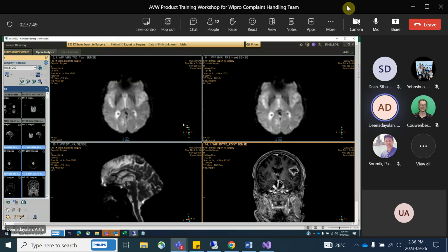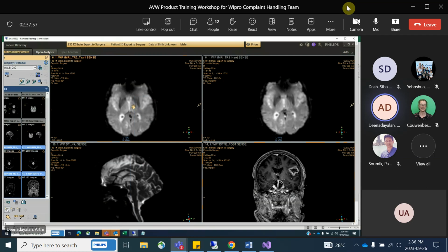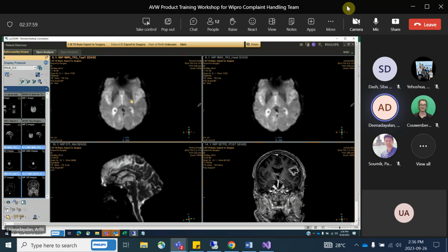And I'll tell you the reason why it is linked. For example, now I right click and do a pan. I'm doing a pan operation. Can you see both the series pan together? So whatever operations you perform, be it pan, zoom, or scroll, except the measurements, will be done on both the series because you have a link between both of the series. How do you unlink it?